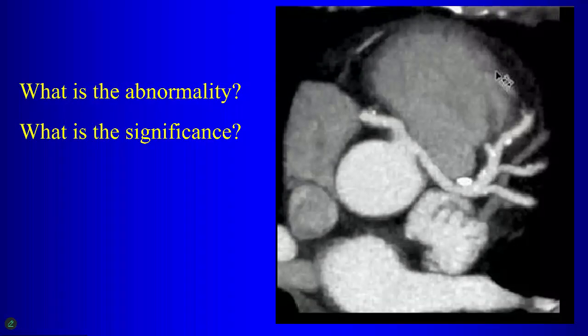So what vessel is this guy? Right, yeah, so that's the right coronary artery. Okay. And so this guy over here, left coronary LAD. Yeah, so it's going into the LAD over here. What do we have in this case? They share a common origin. Okay, and what's important about this?